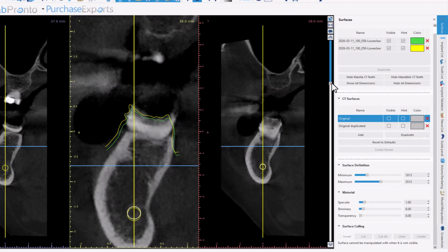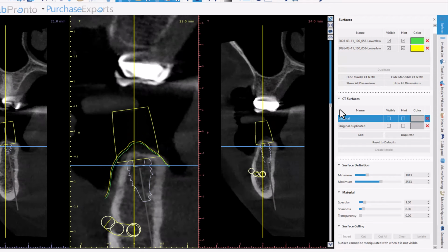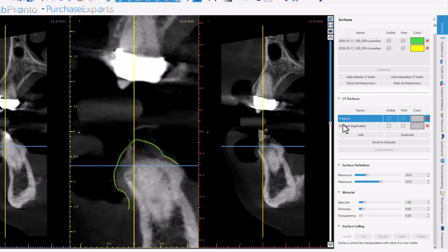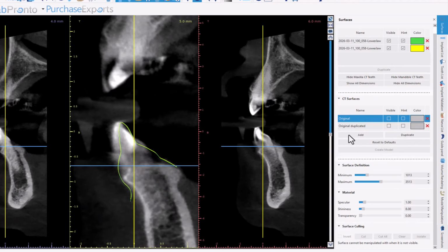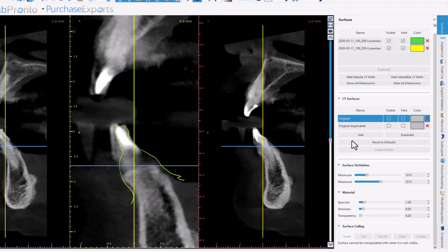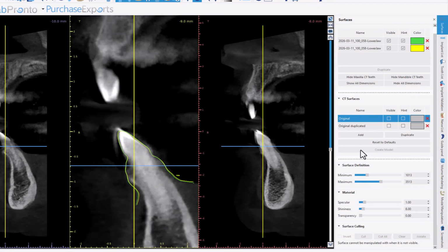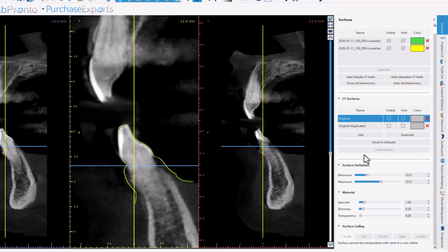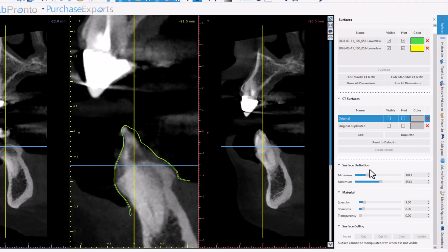So if I go all the way over here to this side and check it, so far I like the yellow one best. Now they start to run pretty close together. Okay, pretty good.